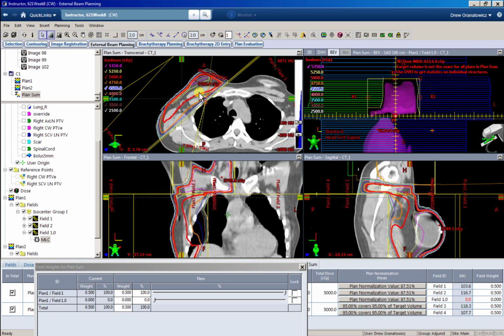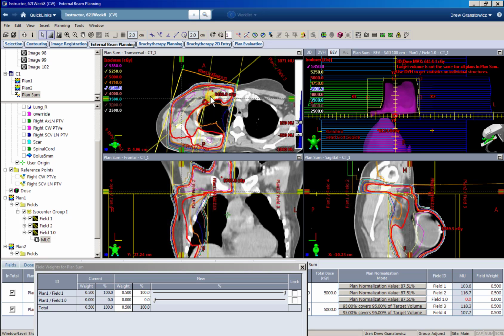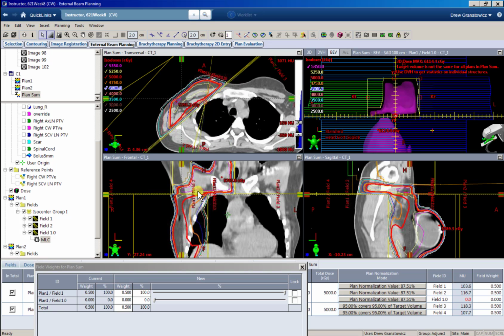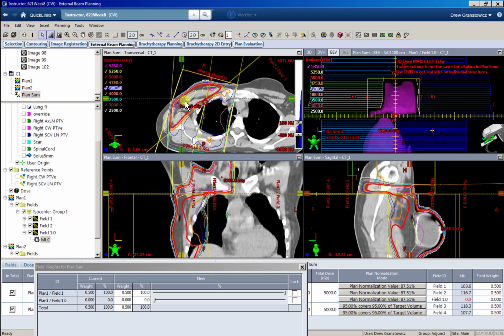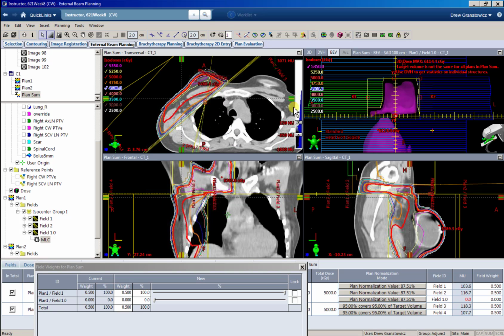So before I do that, you can see you're always a little cold right at the level of your isocenter, right? So these MLCs that we kind of opened up below our match point, it helps make your 100% line continuous. So you see how our 100% line never completely goes away? That's good. And I just kind of found that if you open those MLCs a little bit, even though you cover that area with your jaws, you want your jaws to match perfectly, right? So our jaw settings are at 0 and matched perfectly, but I open those MLCs behind the jaw, and it just helps make that 100% line continuous.